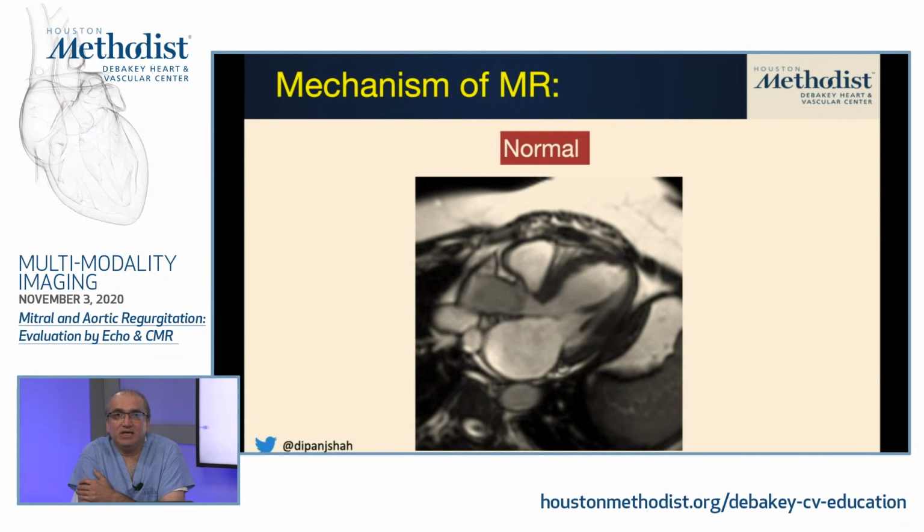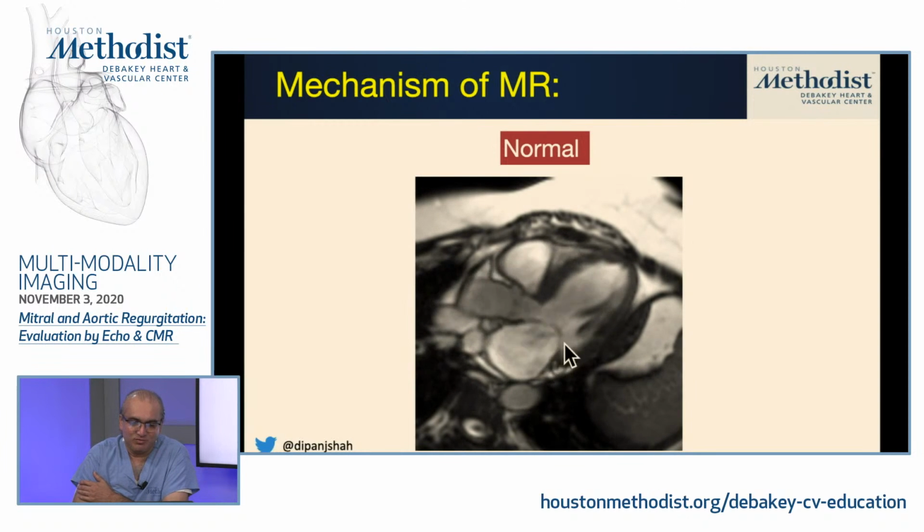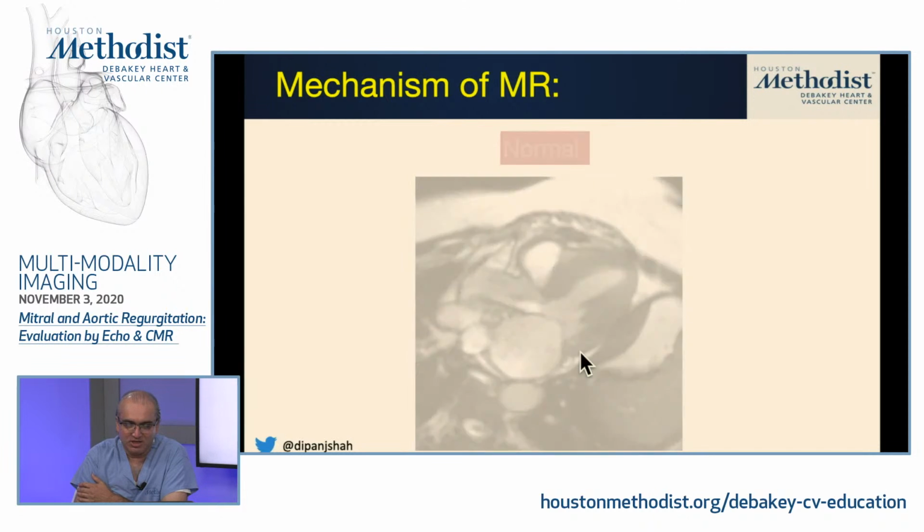So obviously, here's an example of a normal patient, or a normal mitral valve, I should say, where you can see there's just a small amount of physiologic mitral regurgitation.